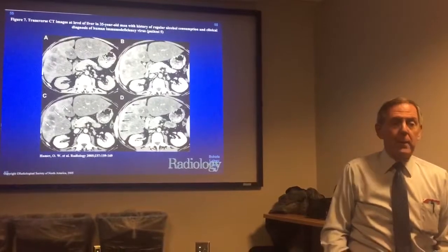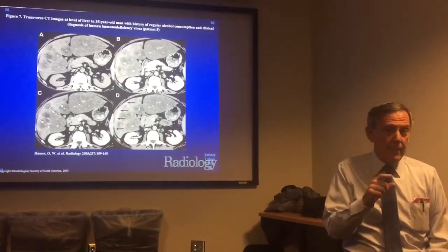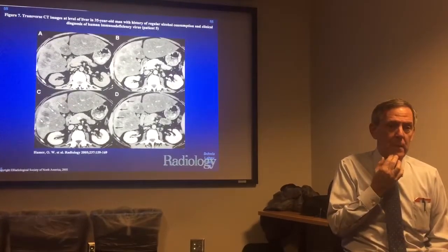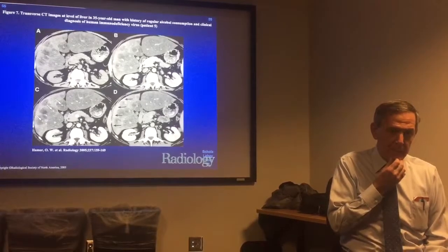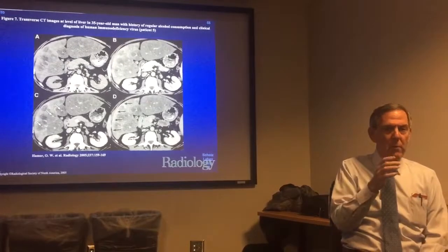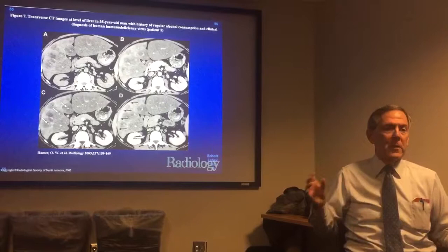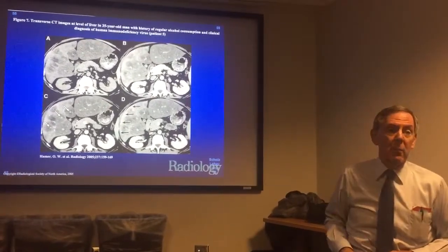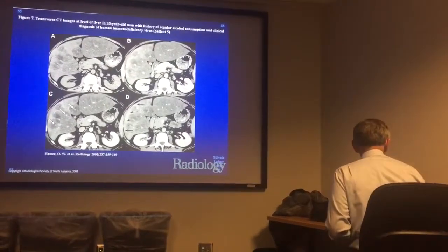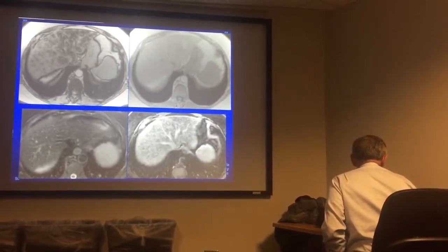You look at the history, and if it has those perfect leopard spots with blood vessels perhaps running through, you know what it is. There's nothing else that will look like that. And the rims, you notice, remember, they were all perfectly thin. They were all uniform. It was all sort of a metabolic process rather than a random neoplastic process where all the cells are growing at their own rate. You know, autonomous republics of evil. So that's that. Enough already. The MRI.